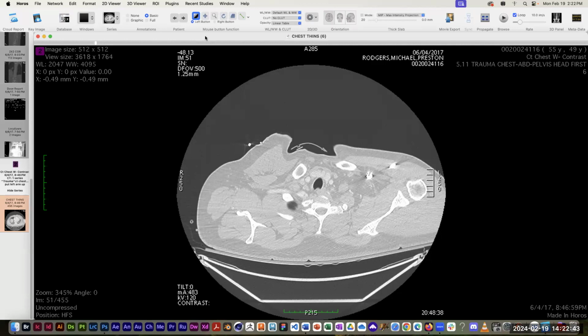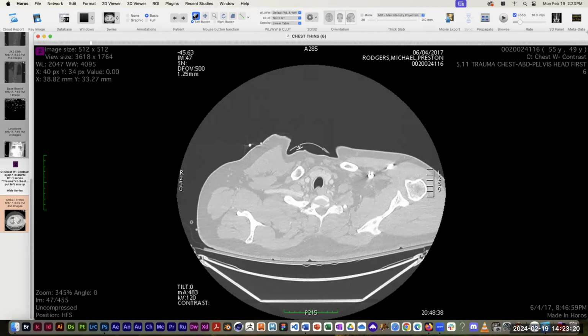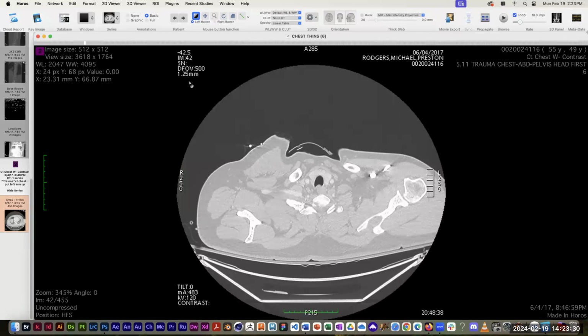that number is always either 0.62 or 0.63. So in reality, what that's telling me is that the slice interval is actually 0.625 millimeters. It just doesn't have enough decimal places to show me 0.625. So it's switching between 0.62 and 0.63. But that means that the spacing between all of these cross-sectional slices is just over half a millimeter, which is very fine resolution. So 0.625 is my number. I'm determining that by simply scrolling through the different cross-sectional slices and looking at that number. That's a measurement in millimeters, and the difference between each of these is my slice interval.